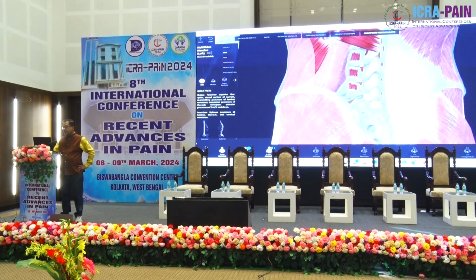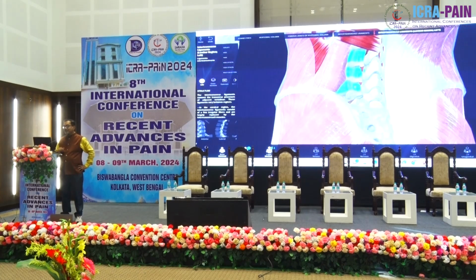What is this and what is this? Intertransverse lateralis and medialis. So intertransverse lateralis muscle. If I am removing that, then we are getting a fascia. What is that fascia? Intertransverse ligament. Okay. So in between the 2 transverse processes, there is the intertransverse lateralis muscle. After that, there is intertransverse fascia or ligament, whatever you call it. And then if you are removing that, then comes the psoas muscle.